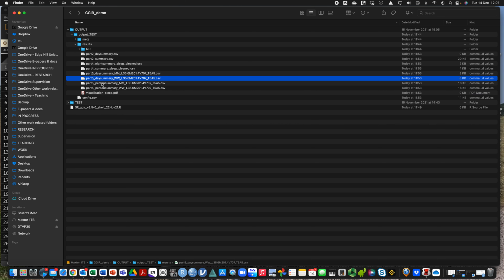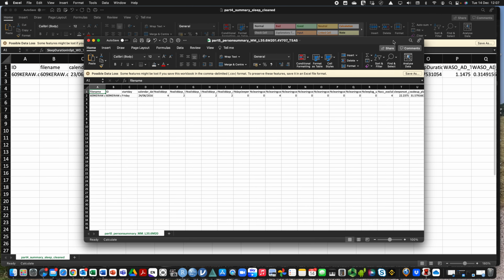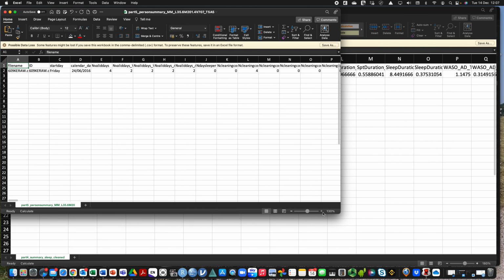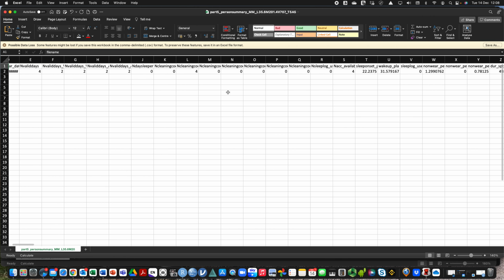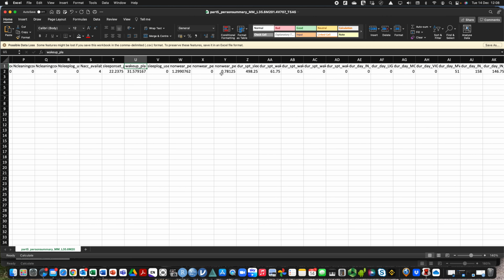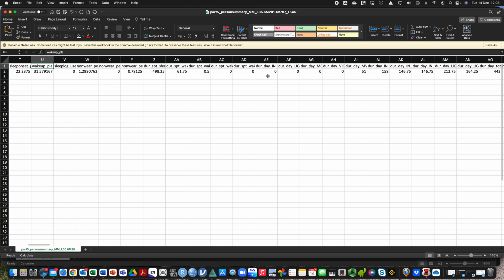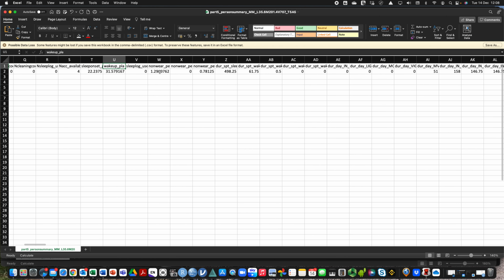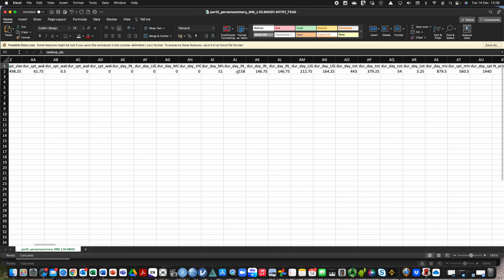And then here's a person summary for part 5. Okay, I'll just make this bigger. So just to demonstrate here, we've got sleep. Yeah, we've got our sleep data first of all for this person. Sleep onset, yeah, wake time. Then it's straight into some of the physical activity data here.